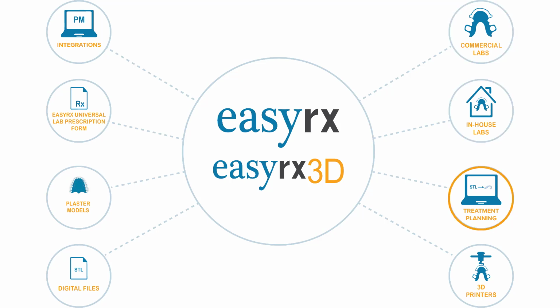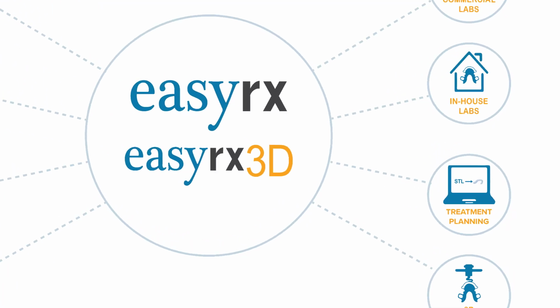We're going to focus on your clear aligner cases. We also integrate with 3D printers, which is becoming an integral component of in-house labs. While we could spend hours going over all the great aspects that make up EasyRx, in this video, we're going to focus on how EasyRx helps you better manage your clear aligner workflow.